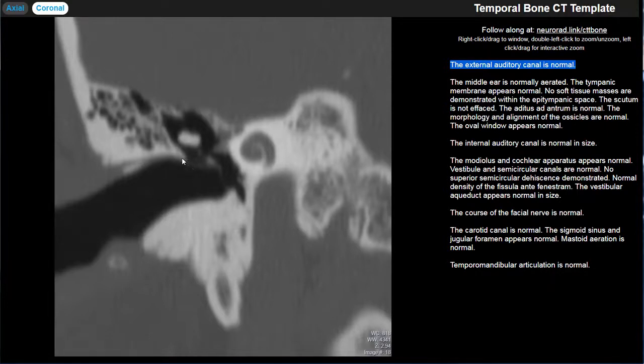This is all important in the context of cholesteatomas, and in particular acquired cholesteatomas. When you get an acquired pars flaccida cholesteatoma, that occurs at the superior aspect, and cholesteatomas cause bony destruction. So the first thing it'll erode is the scutum. So you need to get used to what a nice, sharp, normal scutum looks like, because eventually you're going to be asking yourself the question, is that scutum normal or is it eroded?